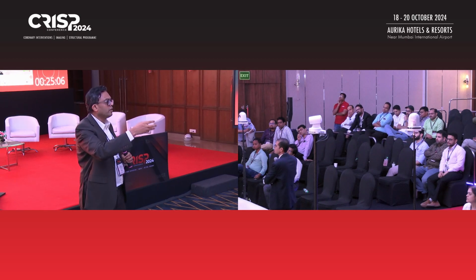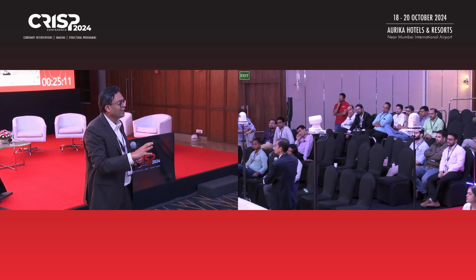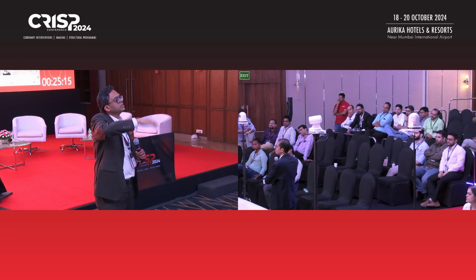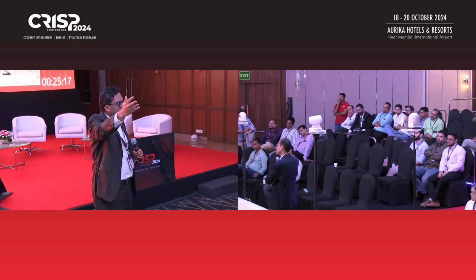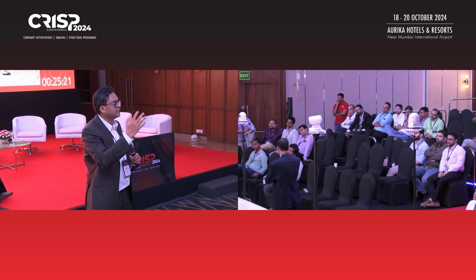How high should be your valve? The valve should be as high as it should not get embolized, basically. So if you go higher, the coronary obstruction risk is higher. The younger the patient, the more problem that coronaries might not be accessible. The lower you go, the more the pacemaker risk. So that is one more thing.